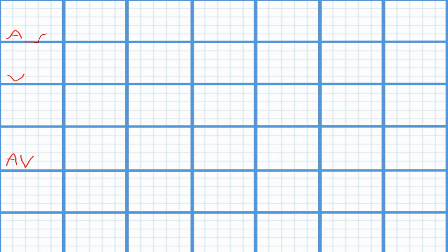So you got your P waves right there. And so this is going to come every 5 little blocks. 1, 2, 3, 4, 5. Here's another P wave. 1 little block up, 2 little blocks over. All right. So once again, 1, 2, 3, 4, 5. All right. 1 little block up, 2 little blocks over. Repeat. 1 up, 2 over.